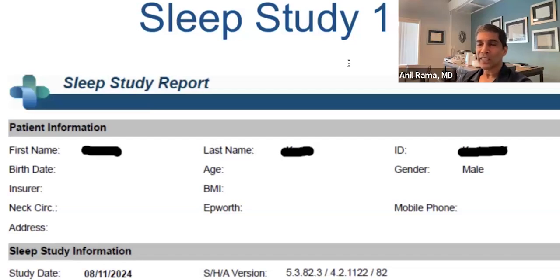And it's rarely hand scored by the doctor. Rarely. I mean, one in maybe 100, it's very rare. The only time I hand score it is if there's electromagnetic interference. Sometimes the study does not come out properly, and you have to go in and remove some of those electromagnetic interference artifacts. And that's about it.